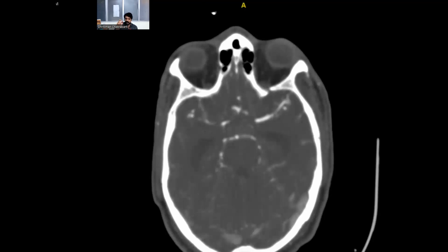After that, the P2 is from there till the bend. P3 is the posterior portion in which it goes along the midbrain and then into the occipital cortex, and then it divides into multiple branches. The terminal branches are the P4. Okay, so let's just look at that again in this.